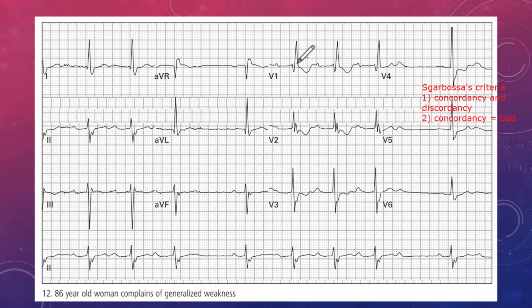Okay, there we go. All right, so let's say we had something that looks like that. Then that's obviously going to be concordant, and that's quite a problem.